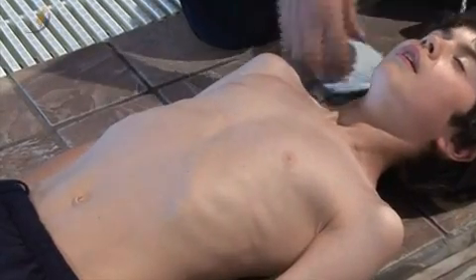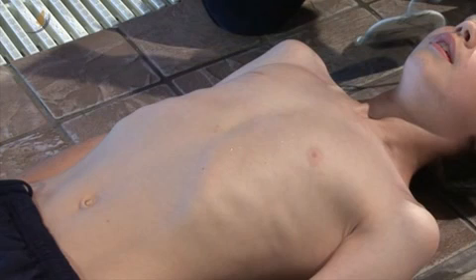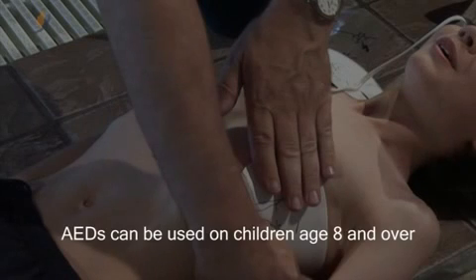Cardiac arrest in children is rare and is usually caused by a breathing problem or an airway obstruction. Although you may not recognize the exact age of a child, AEDs may be used on anyone aged 8 and over by responders.